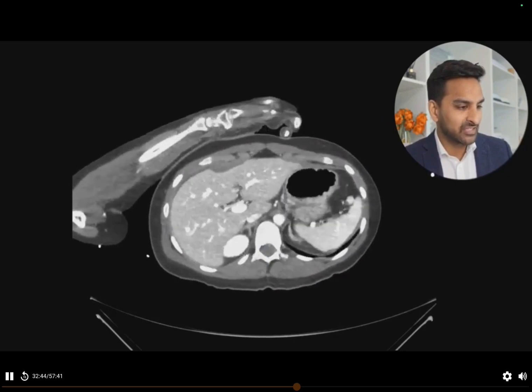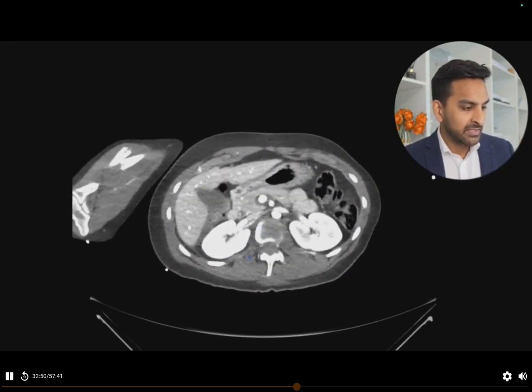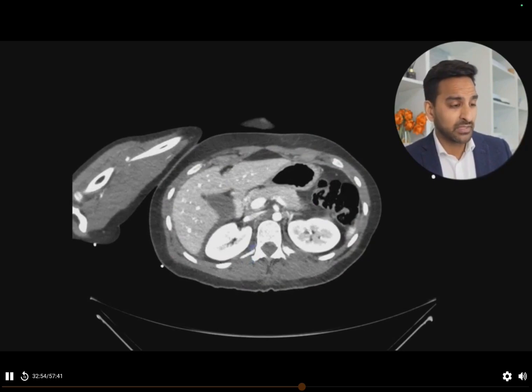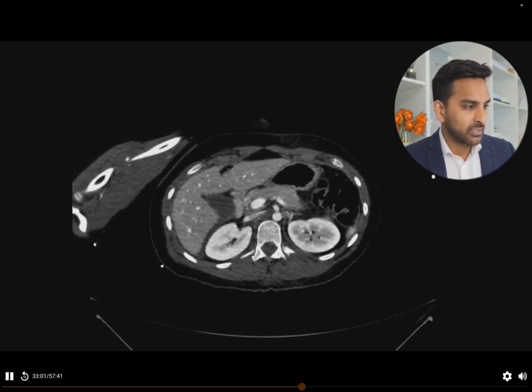causing that indentation. Right. Because you've got quite a significant injury over here, we've got to look and make sure there's no other injuries anywhere else. The kidneys are very, very bright. They don't look like they're particularly abnormal. Ideally, I'd actually probably window the kidneys to be a little bit less bright so I can have a closer look and see what's going on with the actual parenchyma there.